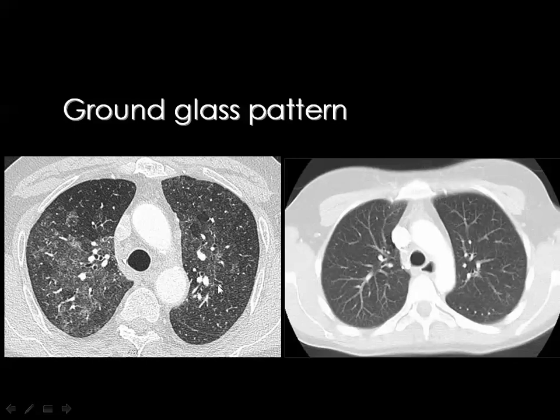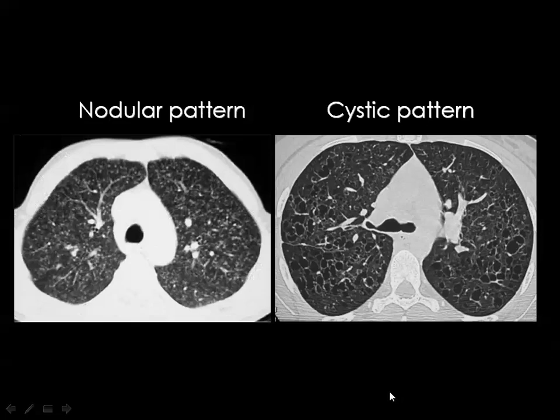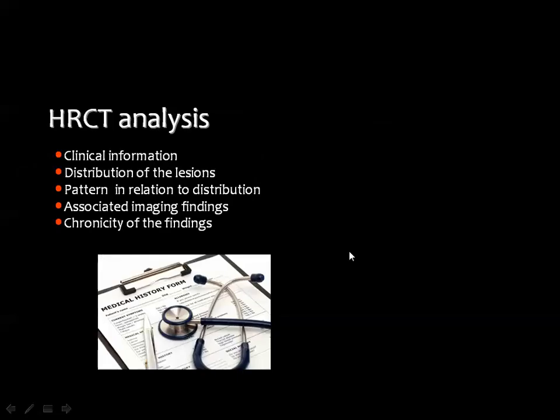You can feel easily that this lung is more opaque and shows many faint opacities known as ground glass opacities. And this is what I mean by the cystic pattern of diffuse lung disease. And this is an example of the nodular or the miliary pattern of diffuse lung disease.